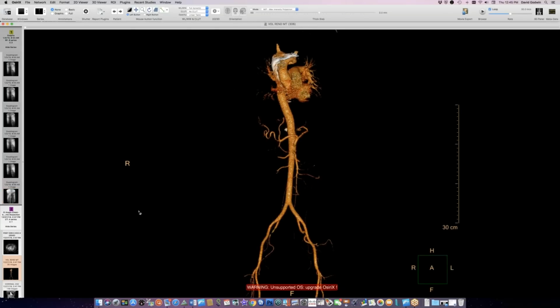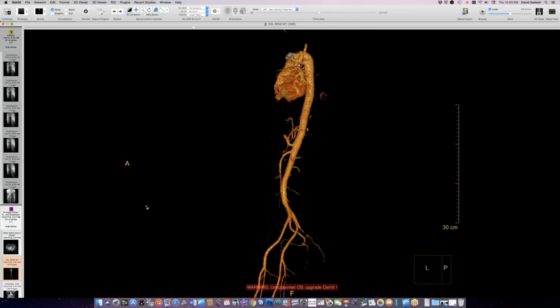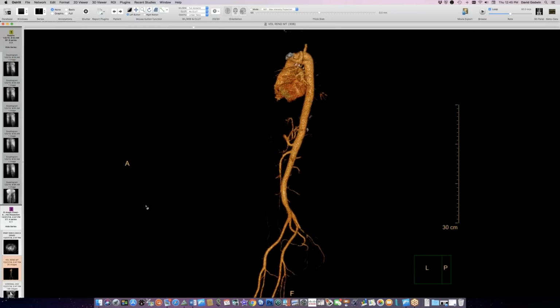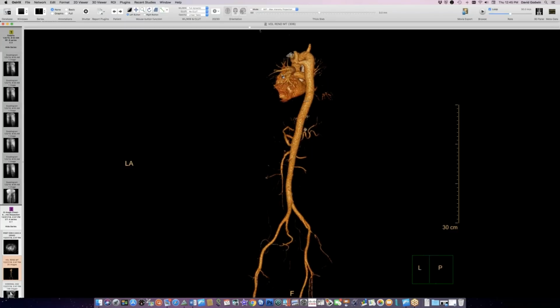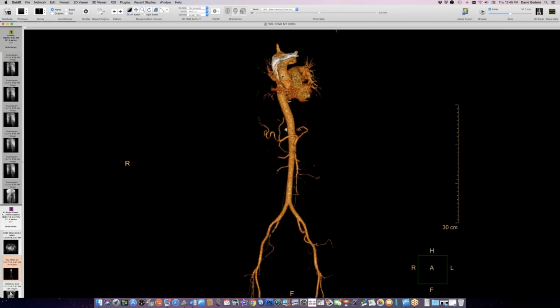So let me go back to her CT scan. She had this very nice, this is done outside, 3D reconstruction of her aorta, and you can see the larger right aortic arch, and here from behind you can see the smaller left arch. So, double aortic arch, and she's in her 50s, so it's probably symptomatic now because of our age and dilation of these vessels with age and stuff like that, but she's obviously survived a long time with this condition.